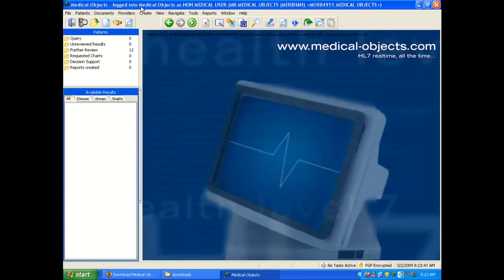So this will tell us the server that we're logged into. This is a really good way to make sure that you're logged into your own server. You'll never be logged into anyone else's, but it's a good way to see. And you'll see that it says we're logged in as a non-medical user called Mr. Medical Objects. And as you can see in brackets, it's called Meridian, which is the other name of the Explorer program. So by this, you'll see that the Medical Objects installation for Explorer has been completed successfully.